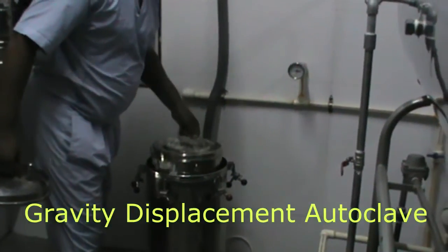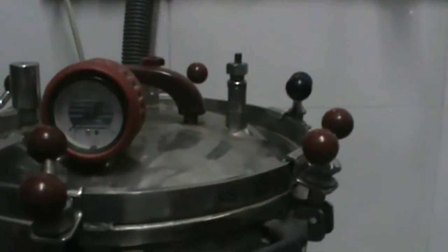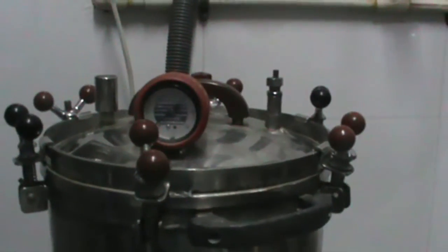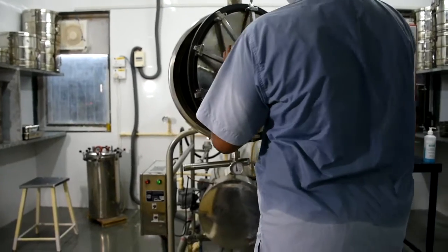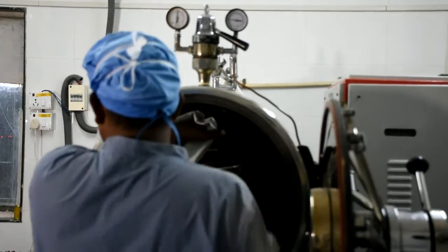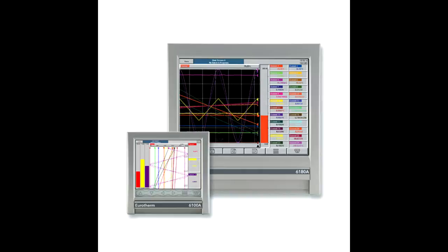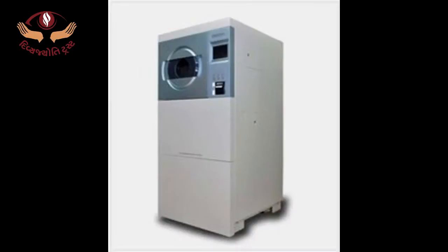Gravity displacement autoclave, class N. This requires a holding time of 30 minutes at 121 degrees Celsius and 15 pounds pressure. After hand washing, remove the drum from the autoclave machine. Immediately close the window of the drum. There are other better but costlier machines available where a graphical record of the temperature and pressure can be obtained. Recently, plasma sterilizers have been launched. They are more efficient but very costly.